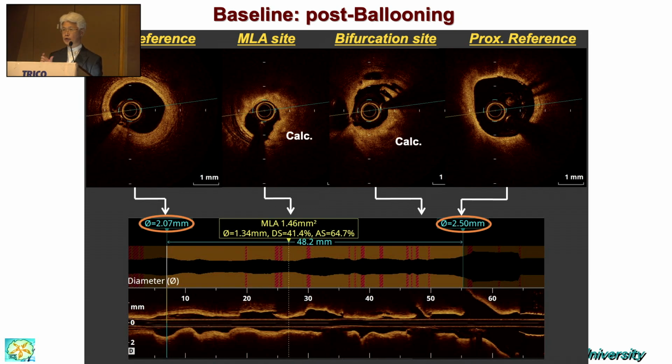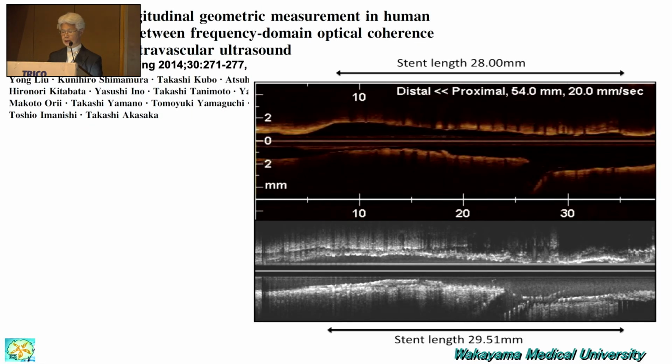Therefore, we decided on a 2 stent strategy, a distal part and a proximal side. So if the distal is 2.25, the mid portion should be 2.5. Therefore, we selected 2.5, and proximal 2.75, because we can dilate up to 3 with post-dilatation. How about the length?